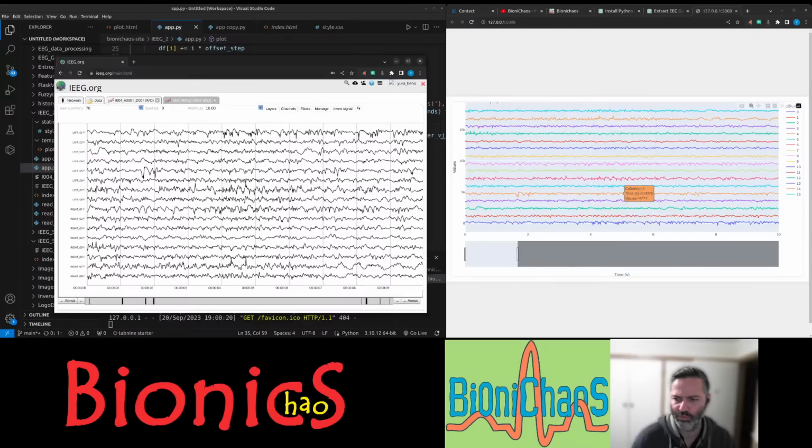So part of 5, we have this. So that feature is this one here. I don't know why it all seems to be mixed up. Yet that bit is right of 5. That's 0, 1, 2, 3. Yeah, it's the mapping of the channels. I don't actually know what it is, but set that channel.